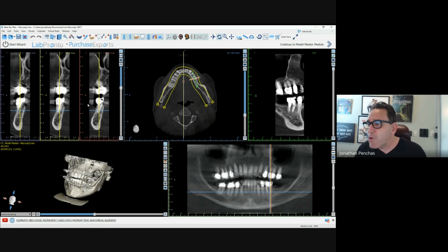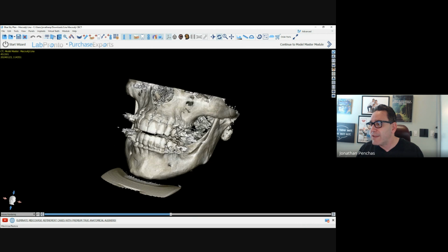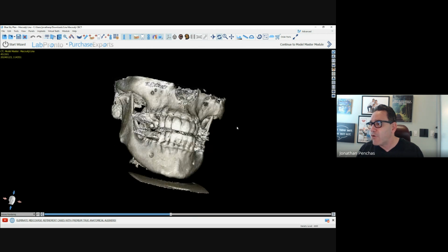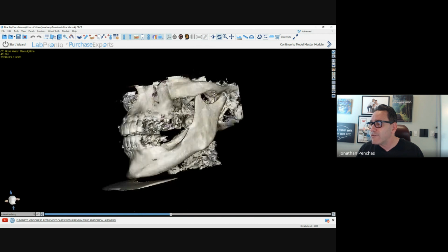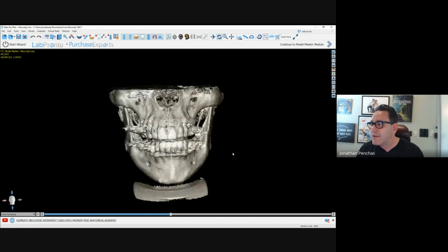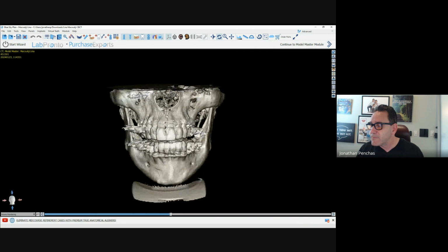So let me walk you around this so you're a little more familiar for each one of you. The most important thing to do is, again, to look at each one of them sequentially and read the whole X-ray. I did this today with Dr. Saab. So let's go and first look at the 3D. That's usually the one you want to go first. We talked about these, what looks like a spray around here. Anybody, what is that?